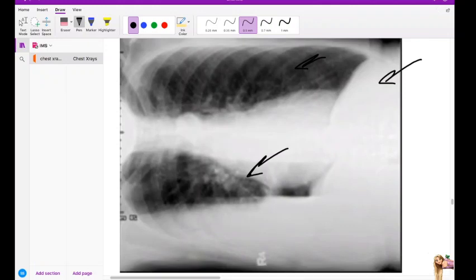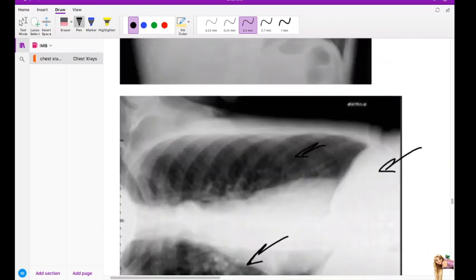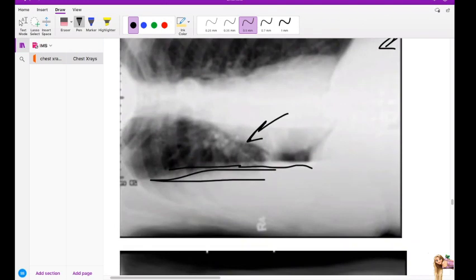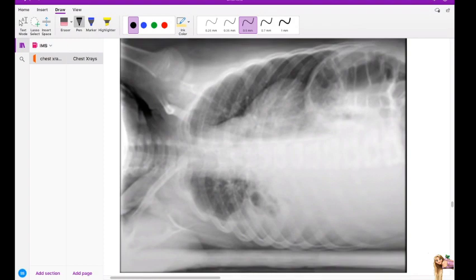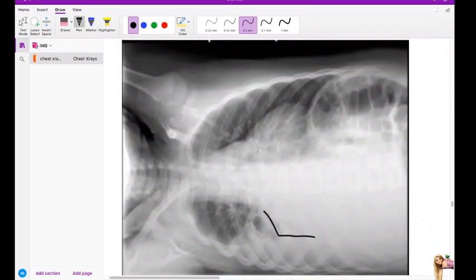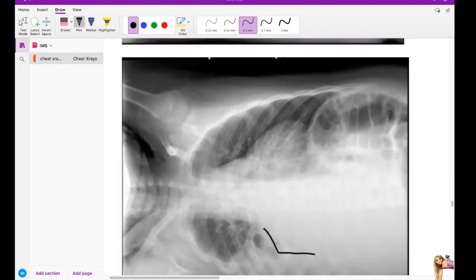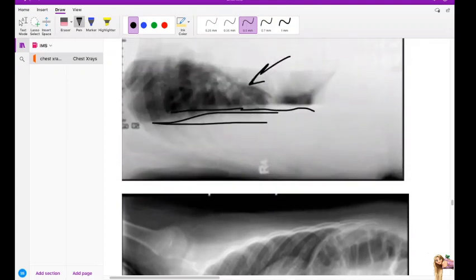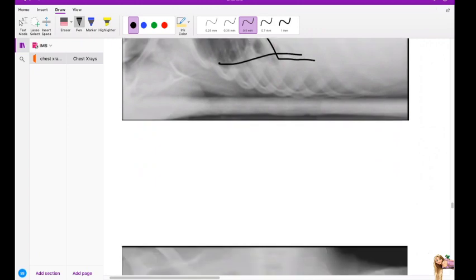In this case, the pleural effusion kind of goes this way. This is a normal pleural effusion. This is not loculated. If it was loculated, it wouldn't go like this. It'll defy gravity, so it won't layer out like this in a loculated pleural effusion. Are you guys understanding?